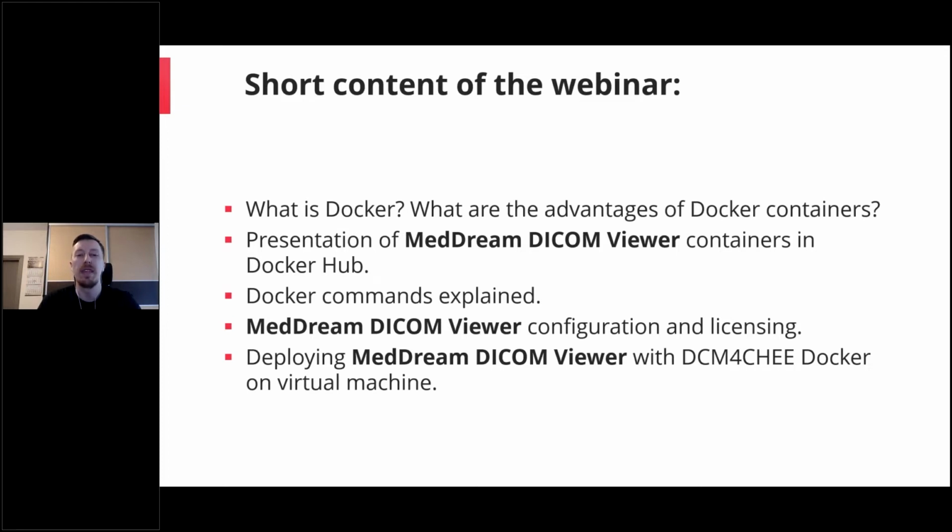Also, we will discuss the MedDream DICOM Viewer configuration, how to configure it to access your PACS or the file system, so you would be able to see the images from your PACS, and also licensing questions. And at the end of the webinar, I will try to deploy and show you how we deploy the MedDream DICOM Viewer plus DCM4CHEE PACS server.